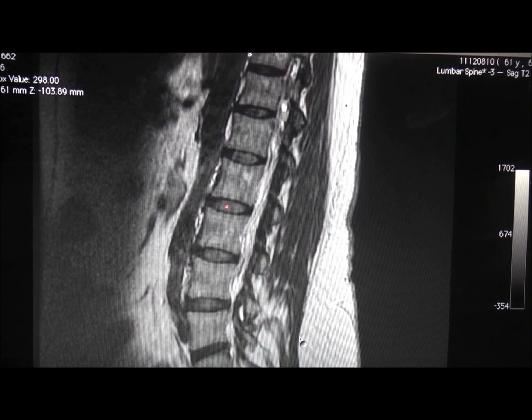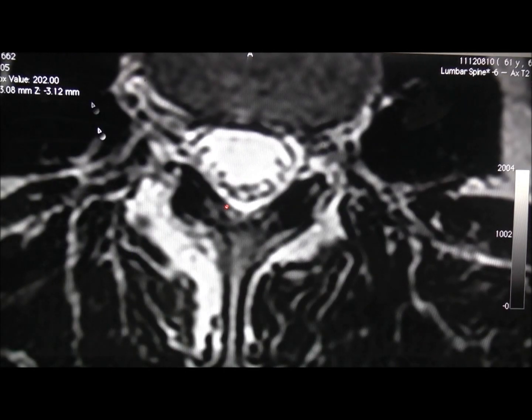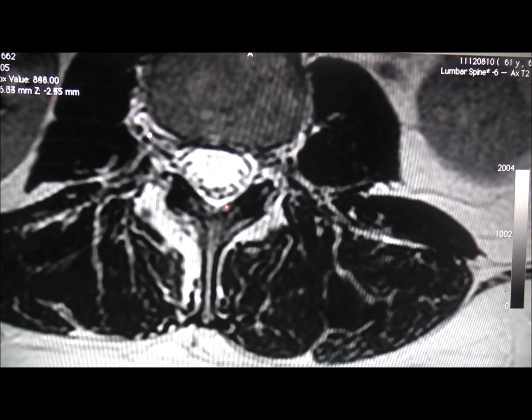As we scroll through, what you see on this view is a little white patch just around the facet interspinous level. So we're going to go over to the axial view, see what's going on at that level. Just minimise this a little bit. Let's do that one more time. There we go. That looks good.